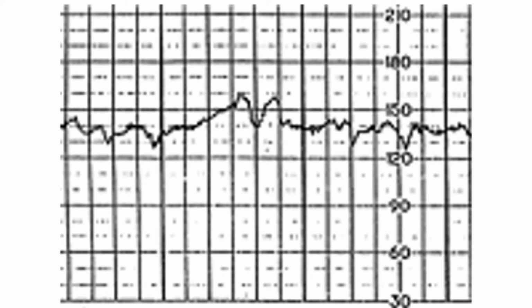So in this particular slide, you can see that this is the rate of the heart. This is the baseline. And as you can see, the line is very thin and almost continuous with very little variability here. But then again, the variability starts to improve here. But over here, the variability is very low. So even if the variability is very low for a short period of time, it doesn't really matter, but it should not be present for a long period of time.